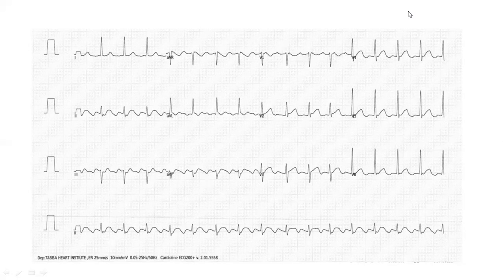Who has raised their hands? Okay. So this by rule is a what? A 2-to-1 atrial tachycardia. So atrial tachycardia with 2:1 AV conduction. That is what you can say on this 12-lead ECG. The P wave is positive in lead V1. It is negative in lead 2. This is a discordant P wave morphology suggesting this tachycardia is coming from the right side. So right-sided atrial tachycardia with 2:1 AV conduction.